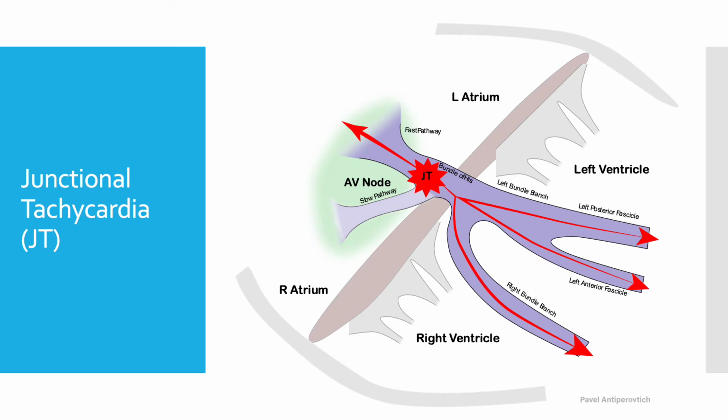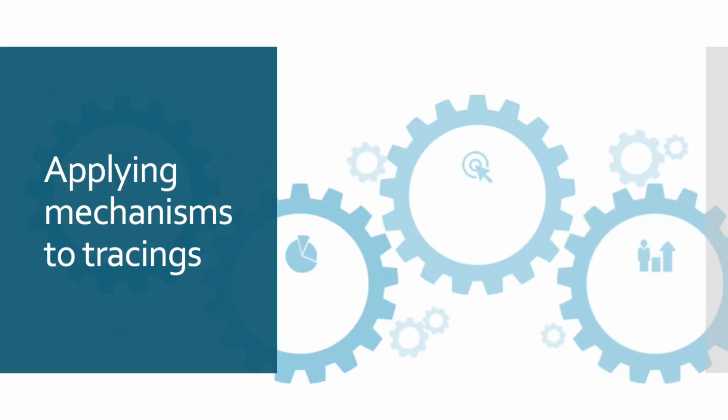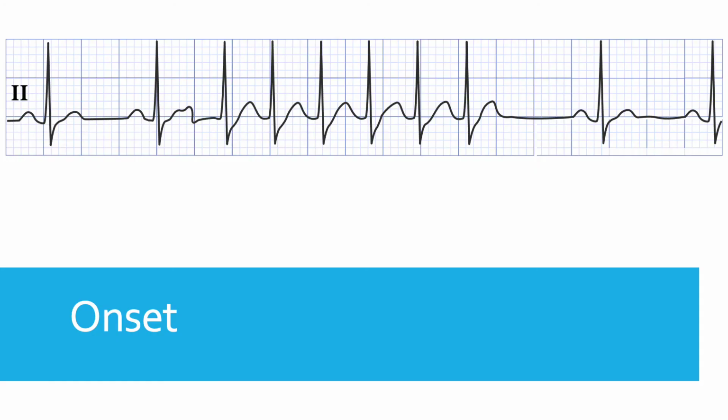up after the QRS. And now we're getting to the fun part of the presentation, which is applying these mechanisms to various tracings. For each tracing, I recommend that you pause the video and review it carefully yourself prior to hearing my explanation. When approaching any tracing, never jump into a particular diagnosis. Always start with making a general observation to frame the problem.